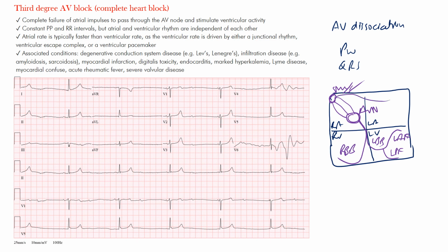All right, so what's going on here? Well, these are all AV blocks, so they're actually happening within that AV junctional region. There's blockage of conduction from the atria to the ventricles. Now you can have a very big complete block here where nothing is getting through, so the impulse starts from the sinus node or somewhere in the atria and then meets almost a halt because it can't get through. Or you may have a block down here that does not let anything get through beyond that, so maybe it gets through the AV node, comes down here, and then hits almost like a stop sign. It won't go any further.